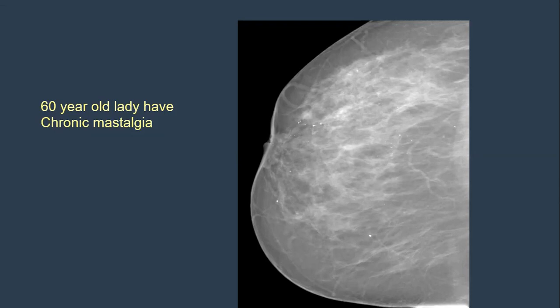Okay, so what do you think? This is a suspicious area. You have to do an ultrasound.